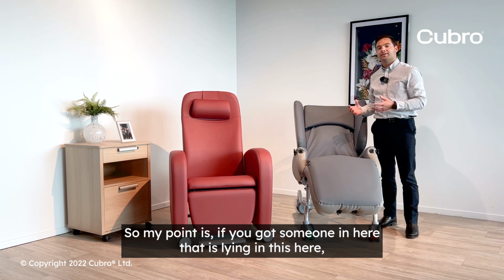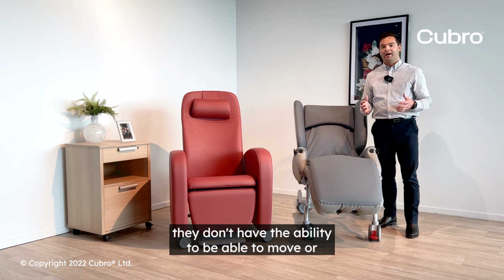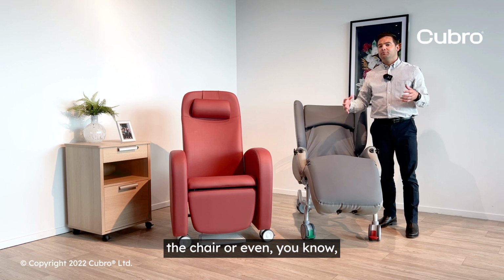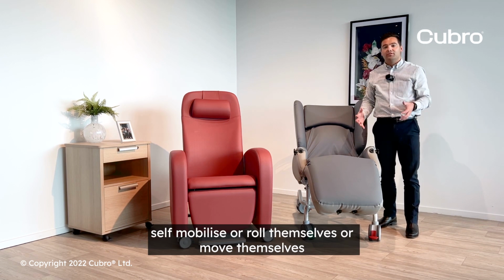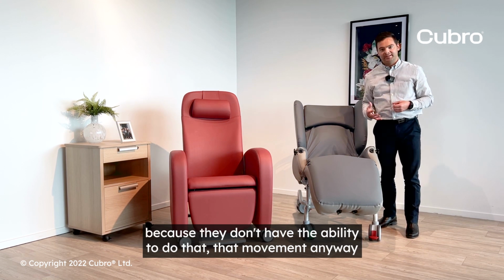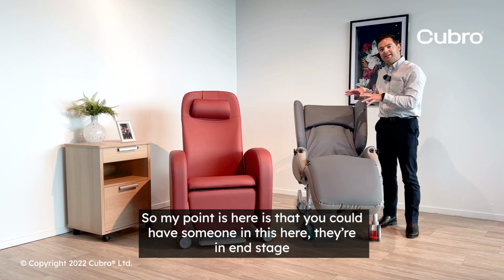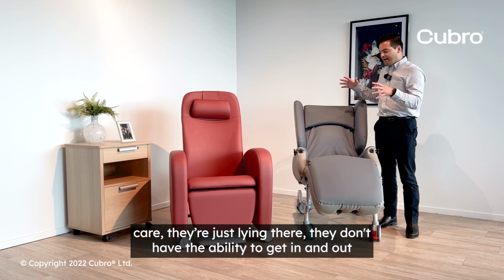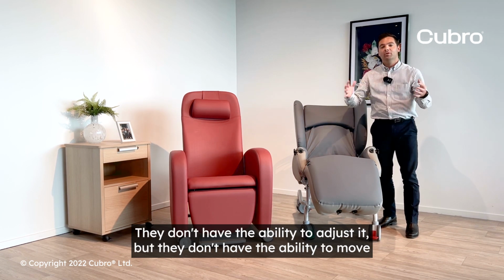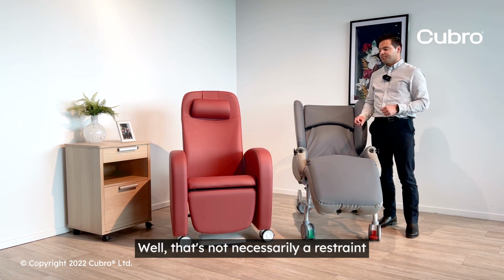So my point is, if you've got someone lying in this chair, they don't have the ability to get in and out of the chair, or to self-mobilise or roll themselves or move themselves, well, it's not necessarily limiting their normal freedom of movement because they don't have the ability to do that movement anyway. So you could have someone in this chair in the end stage of life care, just lying there, they don't have the ability to get in and out, they don't have the ability to adjust it, and that's not within their realm of movement, well, it's not necessarily a restraint.